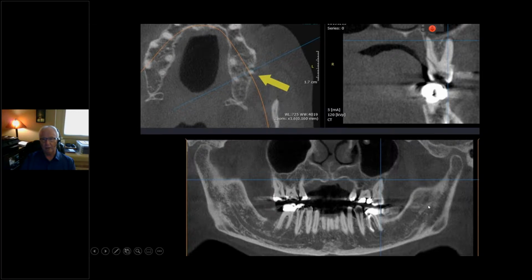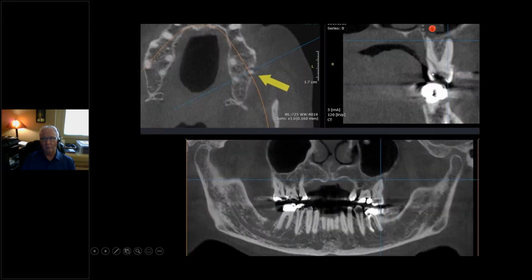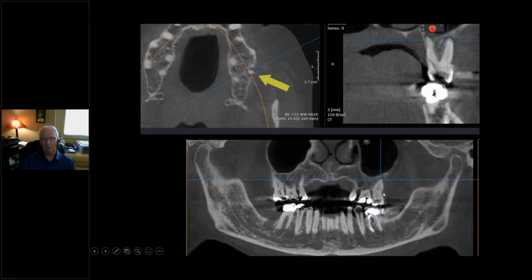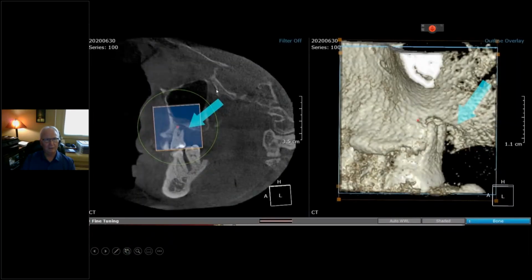We wanted to make sure that they did see it, so we went in and looked at other areas. There's the apical lesion, there's the fracture. We did some more fracture, and then, I'm sorry, that's the same image I showed you previously. I had another one where we showed just a panoramic alone that actually showed the fracture in thin slice. Apologize for that.